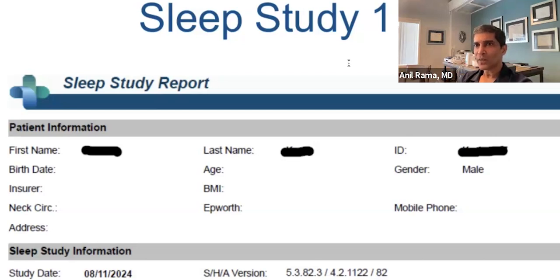Apart from that, even I don't hand score them. I just take it for what it is. For a home sleep test, I think it's good, but it's a home sleep test.